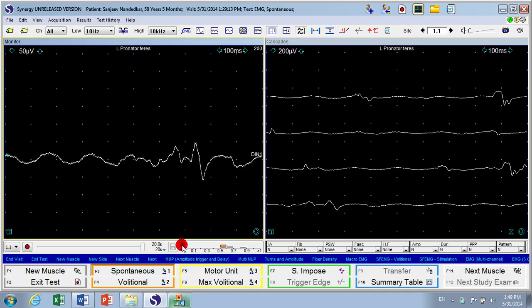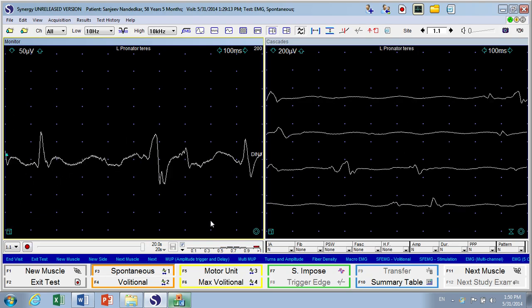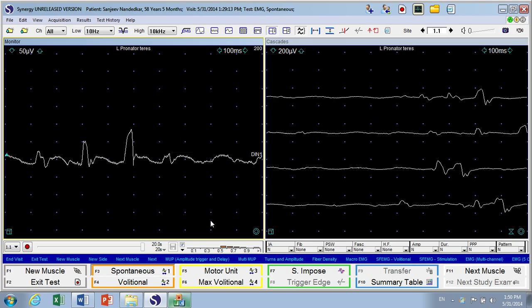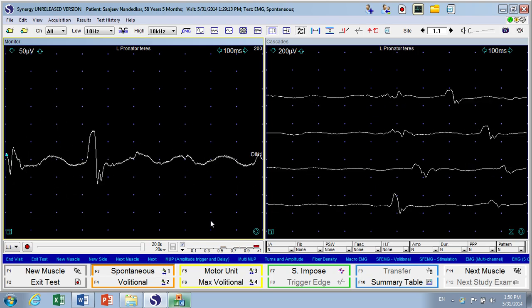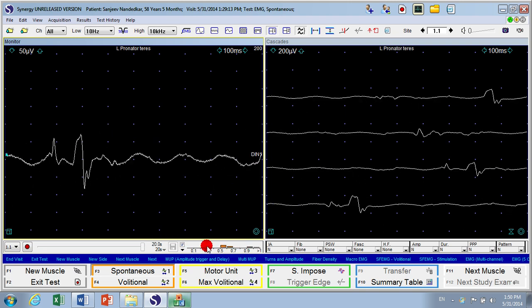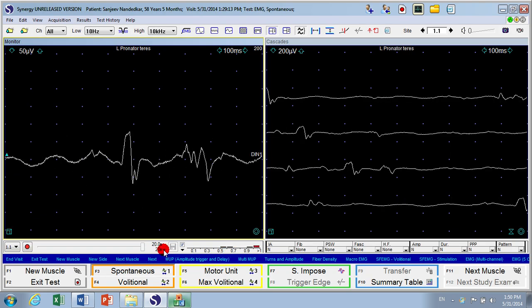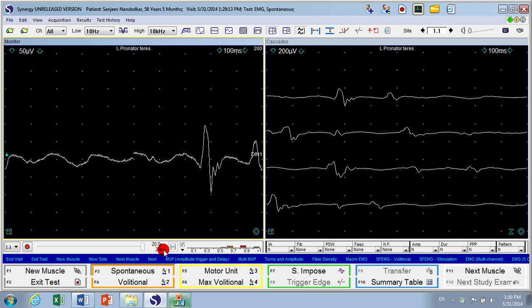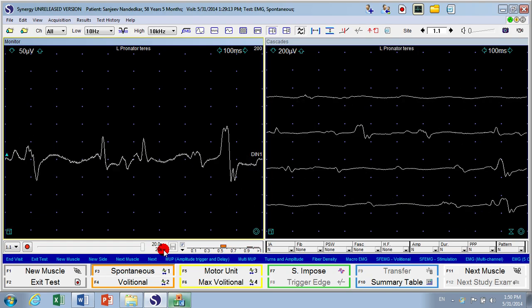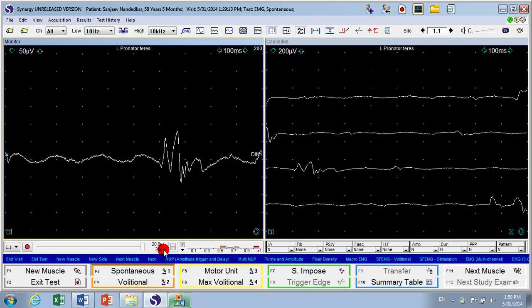There is a check mark over here which indicates that all of our live plays are saved automatically. So that's another change in philosophy. We are going to start saving all the signals so that they can be reviewed quite easily. And again, this setting can be changed. I will show that to you a little bit later, or perhaps in a separate video. The default setting of 20 seconds can also be changed. The system is capable of saving up to 360 seconds. What I want to emphasize over here is the workflow and how it is different compared to the previous version.